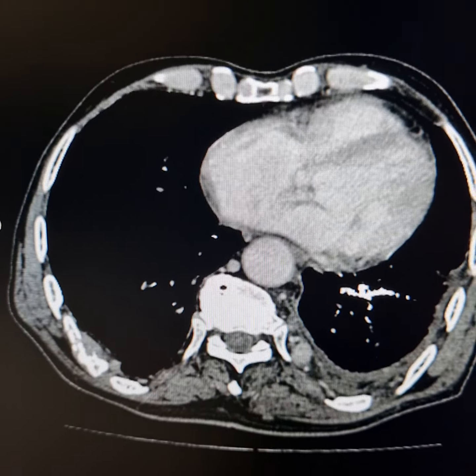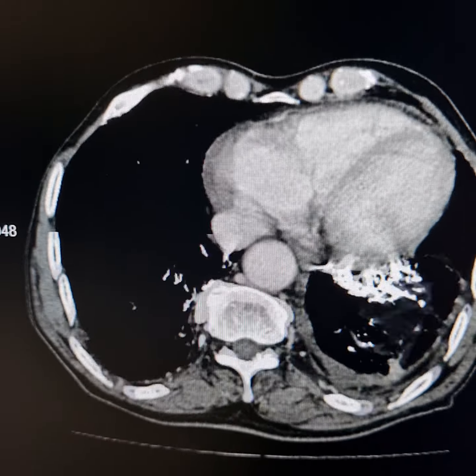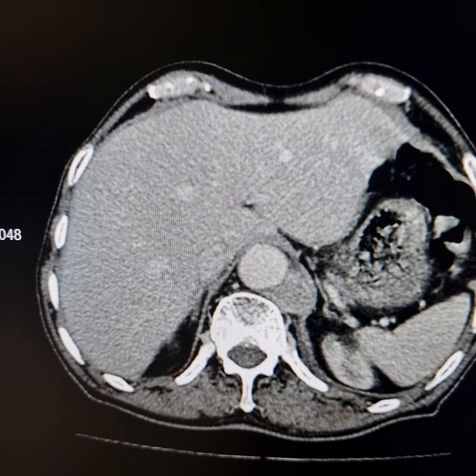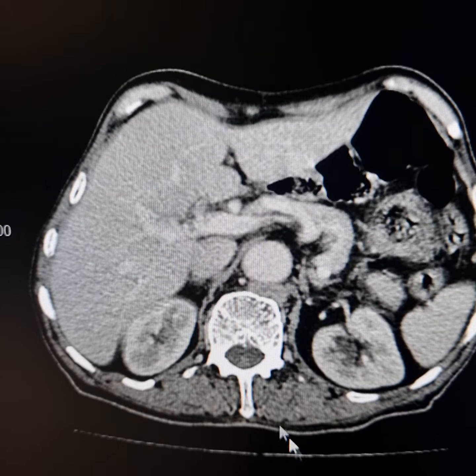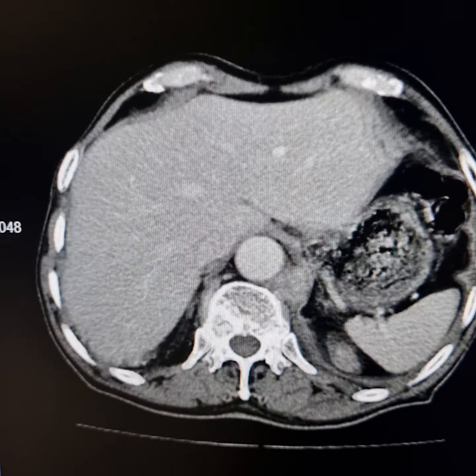Low down, these are the extrapleural metastases here. If I scroll it down, this is an enlarged left retrocrural lymph node. Low down, there is another metastatic lymph node lying posterior to the upper part of the abdominal aorta.